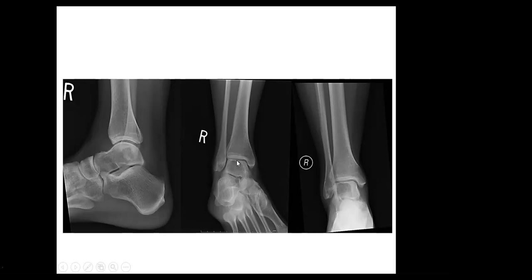That's why I wanted you to be more descriptive on the radiograph before I showed you the MRI, because the term subarticular is very specific. There are only 3 or 4 tumors or lesions that can be subarticular like this. It's chondroblastoma in a child, giant cell tumor in an adult, clear cell chondrosarcoma.